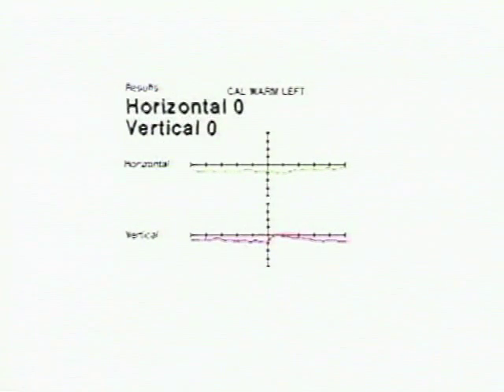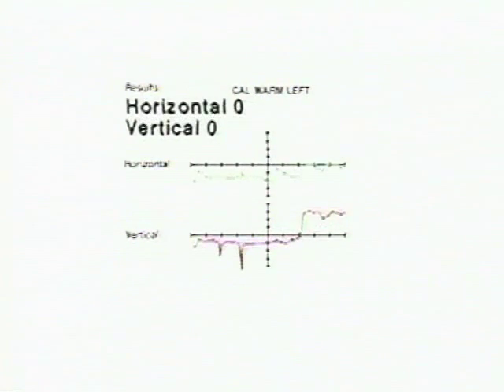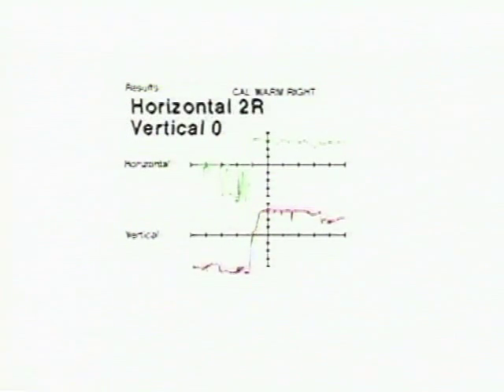In the next 12 examples, we see extremely poor caloric data, which is typically the result of technical difficulties such as problems with irrigation, excessive cerumen being present in the ear canal, infection in the skin of the ear canal or involving the tympanic membrane, or other abnormalities. It is of paramount importance to be certain that the ear canal is unobstructed and that no other obvious impediment to adequate irrigation be present in order to assure that the data is optimal.